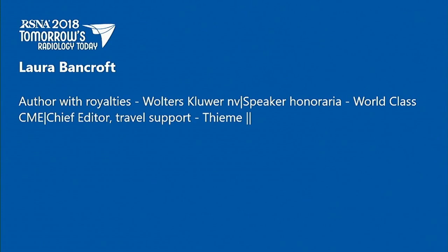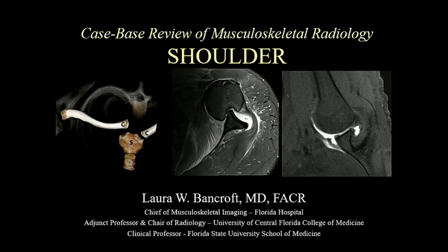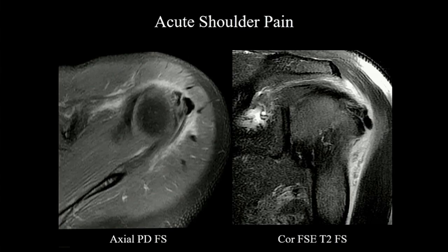Okay, so welcome. In this session we're going to go through several cases of the shoulder. With that, we'll give you a variety of cases, and you can play along with some of these with your automatic response system. So this is the first case.